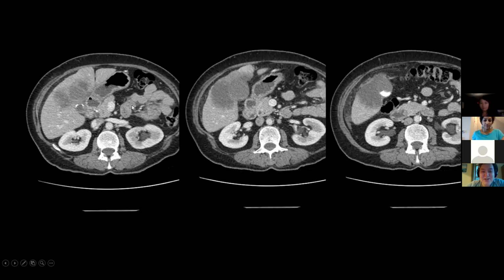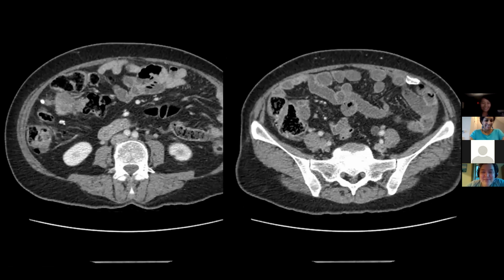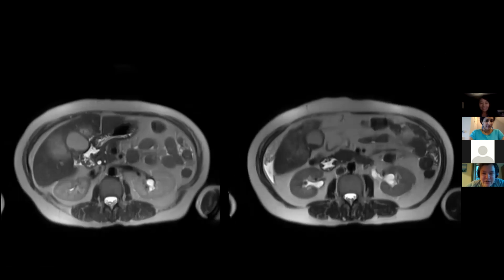That's another option, Nelly. Yes. The patient also externally underwent MR, and here are a few more images. So this is just T2 showing you how high signal this is. This is the gallbladder itself. Yes, there are stones, but there is no soft tissue in the gallbladder, and the walls look pretty smooth on those images.